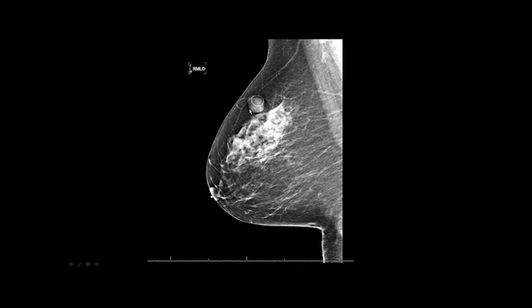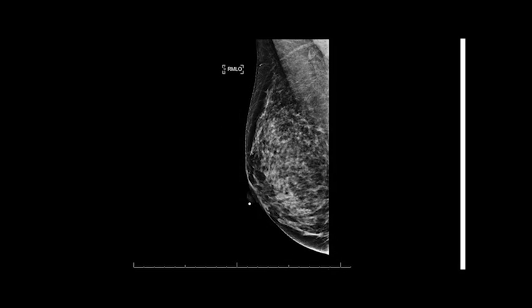This is, I know this patient, this is a sebaceous cyst. It would be BI-RADS 2. Wide superior with convex border. Beautiful IMF. The nipple's not perfectly in profile. Even though the BB is, the nipple isn't perfectly in profile. So be real careful at that. But like I said, they're going to mark you off on something. It's not going to be perfect, but you can at least pass.